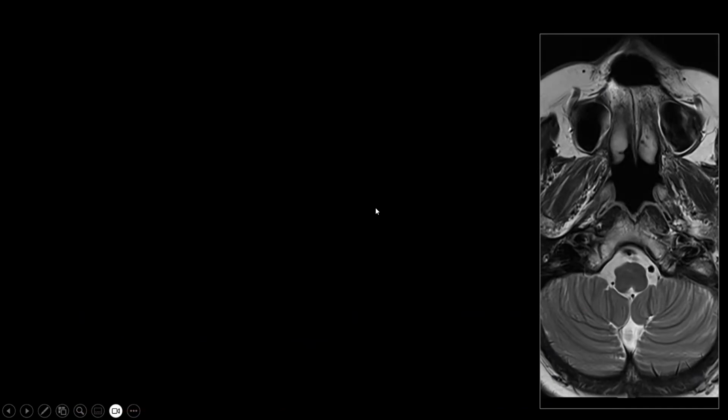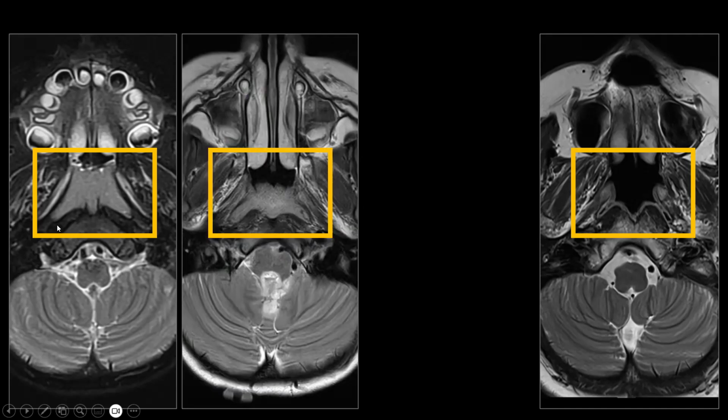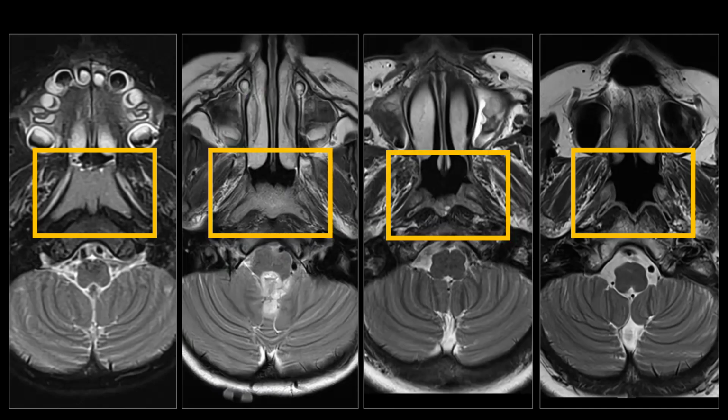We've seen a lot of images of the nasopharynx, and we now recognize the typical morphology of the Torus Tubarius, and also the classical impressions caused on the posterior wall by the longus capitis and colli muscles. But in children, the nasopharynx often looks obliterated by a soft tissue structure, and we get something that looks like this. This structure can persist, but generally decreases with increasing age, and in most adults it's gone. Sometimes it persists, for instance in smokers or HIV patients, but in most patients it has disappeared.